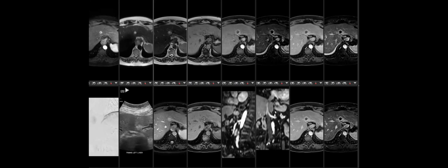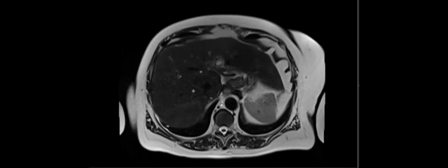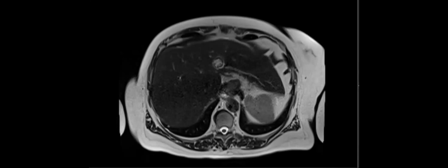This is a patient who had liver disease and a screening MR. So this is the MR actually here. The lesion in question is rim enhancing. It's right here, this thing. Right there. Rim enhancement, LRM, possibly cholangio.